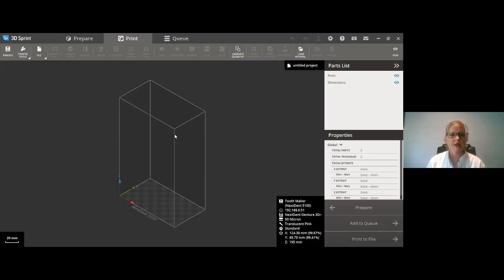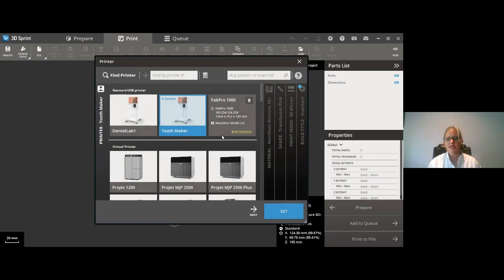Awesome. So I'm going to go ahead and cover stacking now, all of our favorite. Okay, so the first thing that you're going to do, again, if you want to do the stacking with peach or with gray, make sure that you do that material update when it prompts you, when you connect to your printer. I've already done mine, so it's not going to prompt me. And then you'll have to restart your 3D Sprint for any of that to take effect.